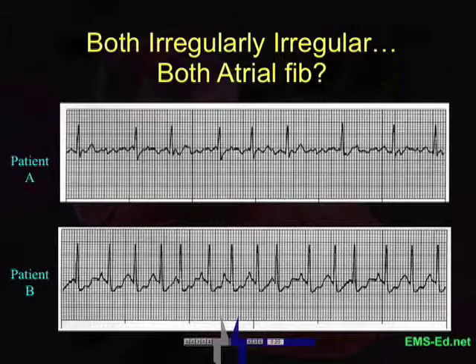Okay, here's a good one, or good two. Patient A and patient B. Question: is one, the other, both, or neither atrial fib? You've got 30 seconds.